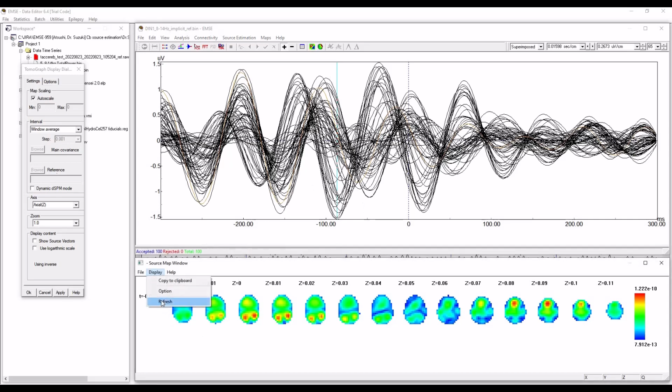Let's go to display, refresh. Yes, and that didn't change. So if I do display, refresh here, you should notice a subtle change or something. Yeah, it changed. We still see what apparently is cerebellum. I'll look at that in MR Viewer to make sure.